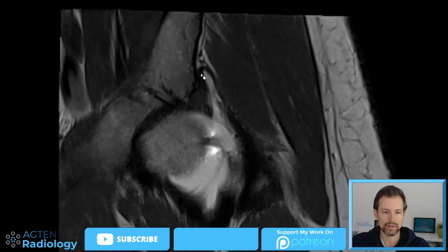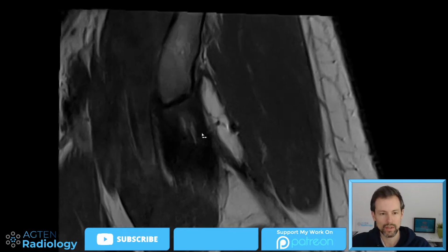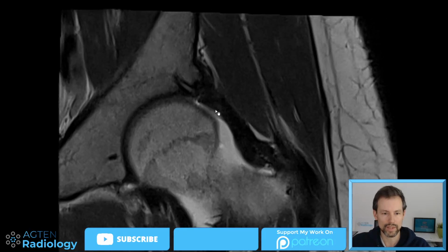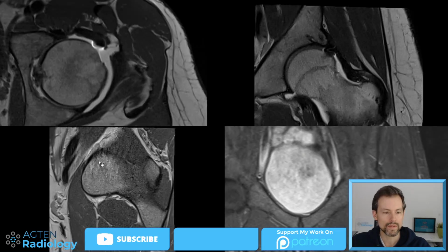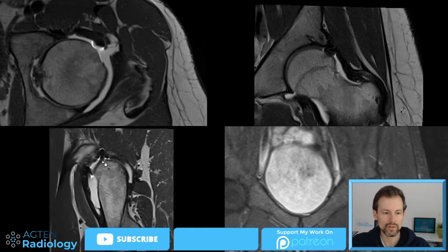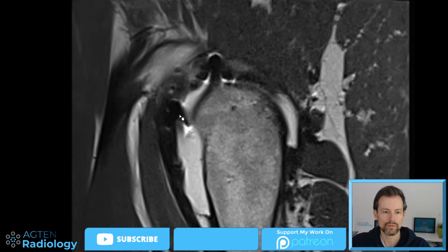So this is now again in the area where we have the pars reflexa of the rectus femoris tendon. Also, it does not go far enough anteriorly, but we can appreciate there should be a pars reflexa, and there is a lot of scarring going on. We have susceptibility artifacts here, a very large susceptibility artifact here as well. And this was in the initial report rated as anchor dislocations. And I've seen this a few times. It's not the first time that I saw reports that mention these susceptibility artifacts as anchor dislocations.